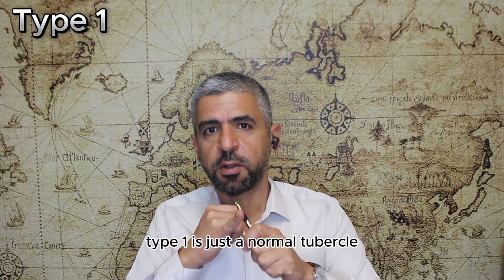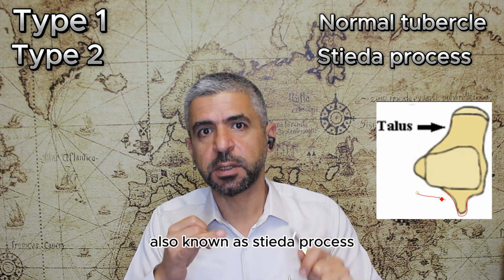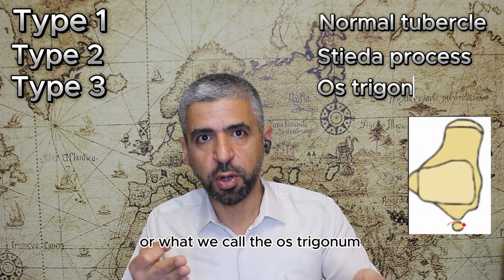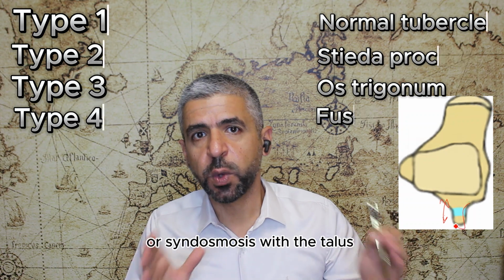Type 1 is just a normal tubercle, while type 2 is an enlarged tubercle, also known as Stieda process. Type 3 will be seen as an accessory bone, or what we call the os trigonum. And finally, type 4, there will be fused os trigonum by synchondrosis or syndesmosis with the talus.